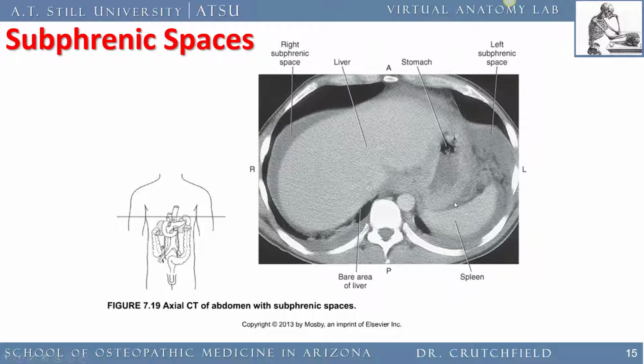There's fluid in here between the spleen and the stomach. There's air here in the stomach, so the stomach thickness is what you see here. And then there's a little bit of fluid in between the stomach and the liver in this area, which is normally where the lesser sac would be. This is air. We are just catching the base of the lungs here.